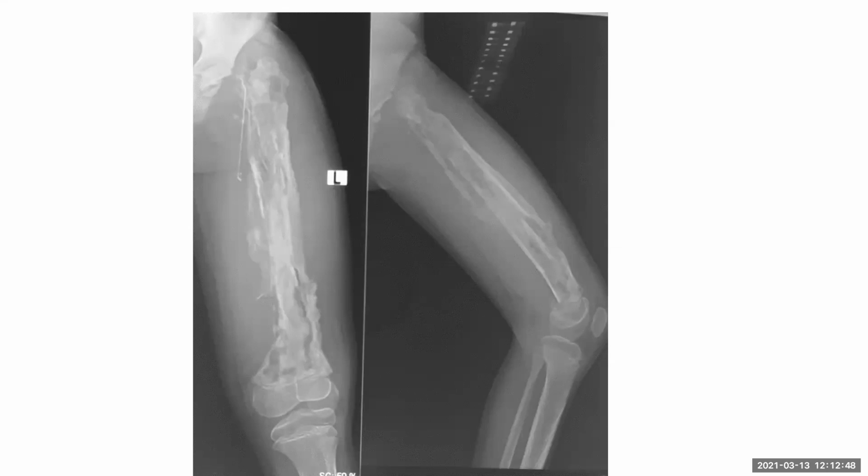Actually, the neck seems to be resorbed. There is extensive calcific foci along the whole length of the femur. There are also lucent serpiginous areas within the distal femur. Seems to be associated soft tissue thickening.